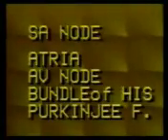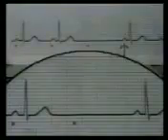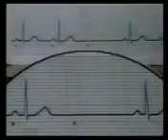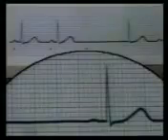So if this beat following the sinus arrest comes from one of the lower pacemakers, it is called as an escape beat, indicating an escape from the inhibition of the SA node. A careful study of the beat after the sinus pause will tell you the origin of the escape beat.